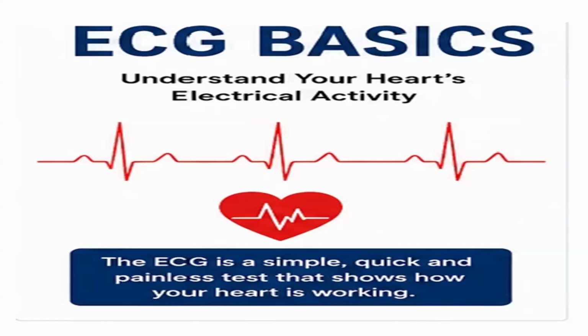In this video, we will learn ECG interpretation from the beginning in a simple and practical way. By the end of this lesson, you will understand what each wave represents, what the important segments and intervals mean, and how to interpret an ECG systematically. Even if you are a beginner, this guide will make ECG reading much easier.